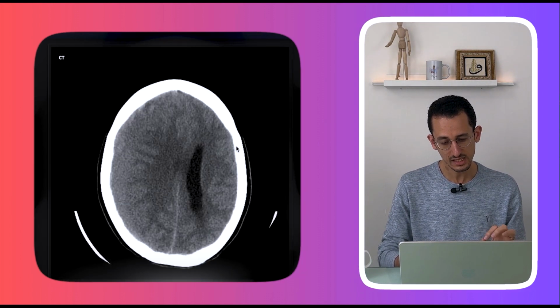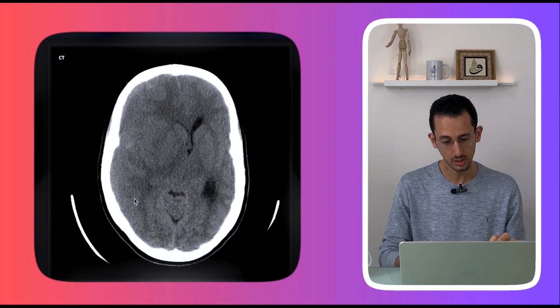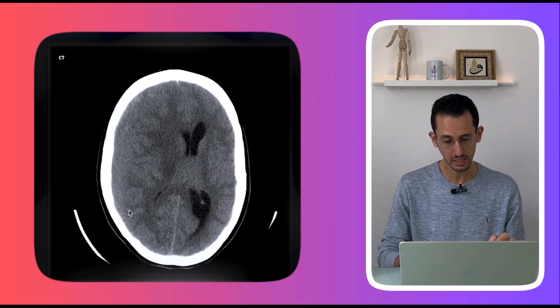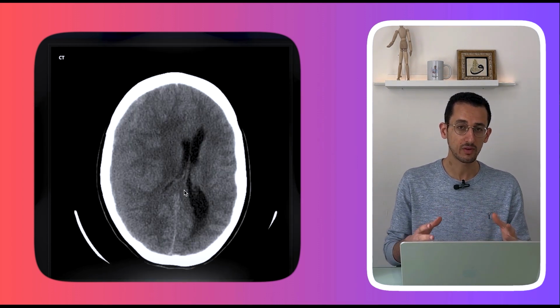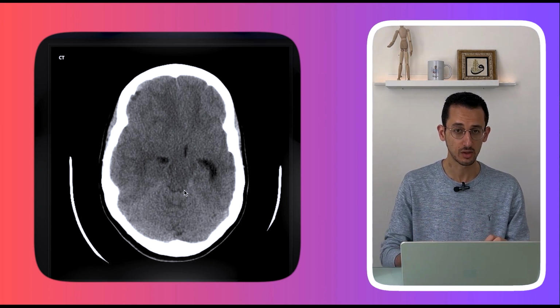But if we have a look at this other patient, if we scroll again, the density of the blood here is slightly different. So it's not that obvious like the other one, but you can see that there is a collection here on the right side of the convexity of the brain. Again, what's more obvious here is the amount of midline shift of the brain, the amount of effacement of the ventricles and the sulci and gyri. So this patient, I would expect, has more profound neurology, more profound deterioration in his GCS and consciousness level compared to the other patients.